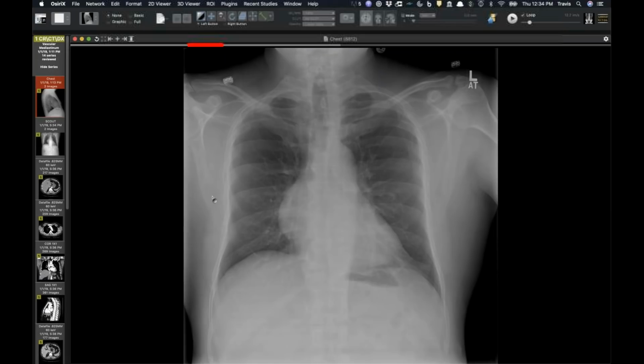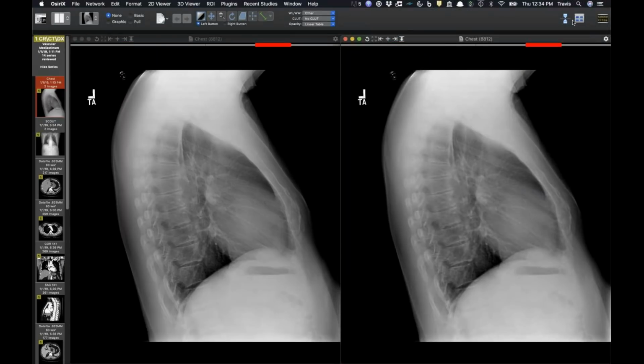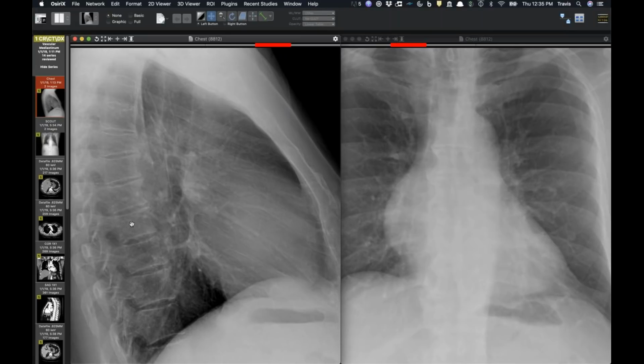This one also came in today, which is something I have never seen before, and I'll be curious to see if you guys have seen this before. This is an outside radiograph from 2 days ago. This is a middle-aged man who had a hospitalization a couple years ago at an outside hospital where they actually detected this abnormality, but he never got follow-up. You can see there's an abnormal right mediastinal border. When you look at the lateral view, in this case, it's more an absence of findings that you see either in the middle or the posterior mediastinum.